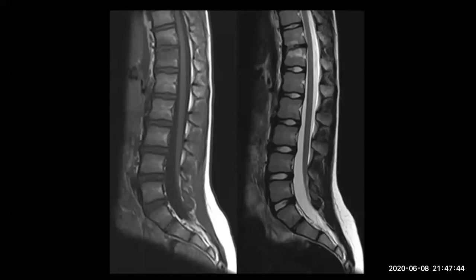At what level is the insertion in this patient? In this patient, it's low, at the sacrum. Maybe lumbar 5 or sacrum 1. S1, okay. Few other things? Other findings? I think there may be changes at the vertebral end plate.